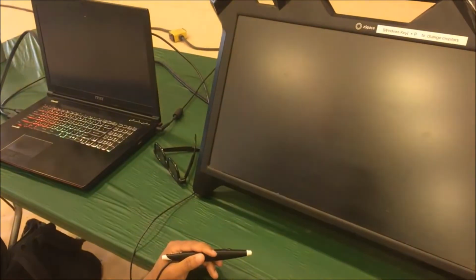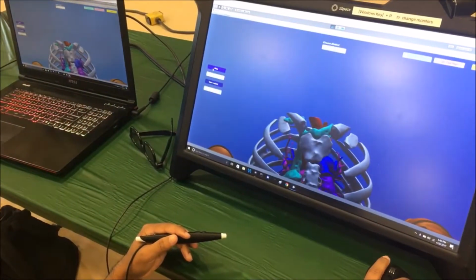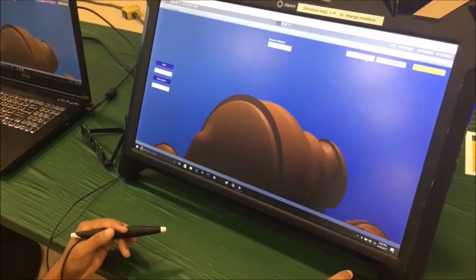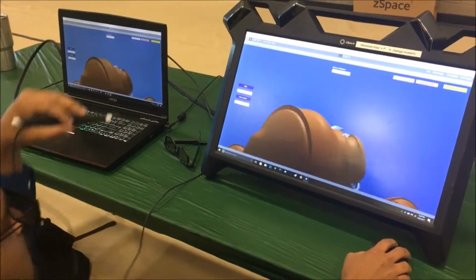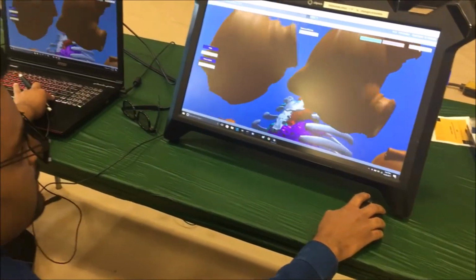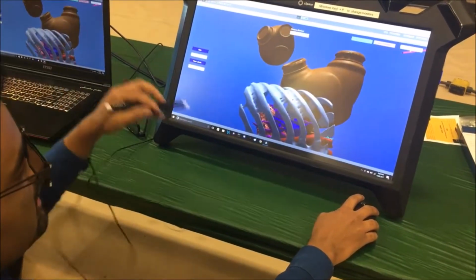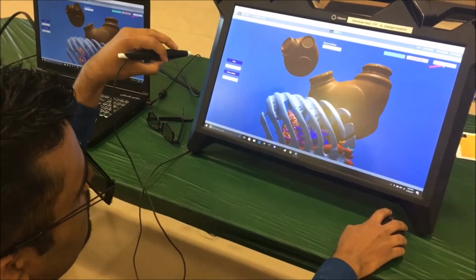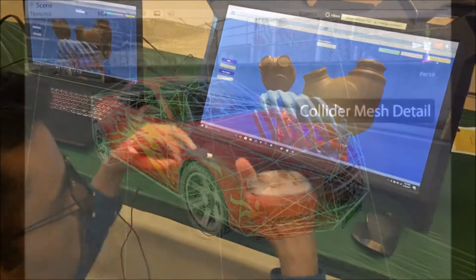One of the other features that we've implemented within our program is loading medical objects. So if a surgeon wants to use, let's say, a total artificial heart left, they can just import it in, and they all have Mesh Colliders, which enables them to be grabbed with the stylus. So I can do the TAH right and the pin. Should be shown right there. And all of these objects can be moved through the stylus. Grab this. Just move it. That's it. Should be good.